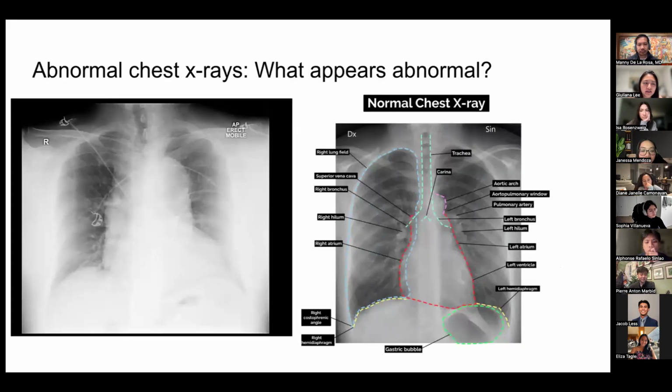Alrighty, let's keep going. So number 2, same thing. Go get out your stamps and feel free to start putting X's where things look different.